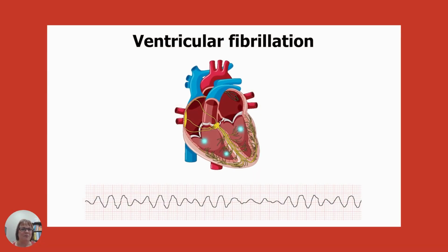So let's talk about VFib. So VTAC, the ventricles are contracting, just crazy, but they're not filling up with any blood. VFib, just think if I'm not getting any oxygen because I didn't get any blood to pump around, now those ventricles are just kind of quivering, okay? And that's what you're seeing right here. So they're not squirting anything out. If you don't shock this person soon, they're going to the light, okay? So definitely a shockable, lethal rhythm.